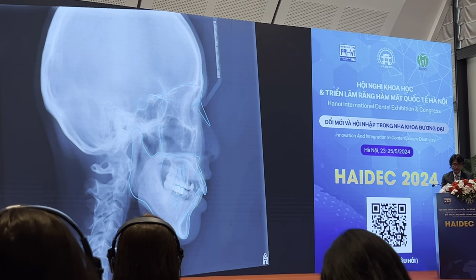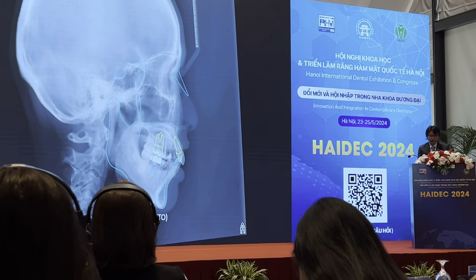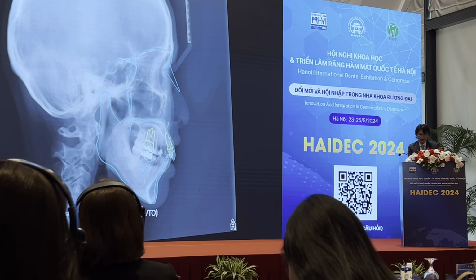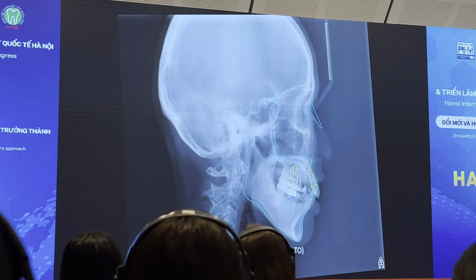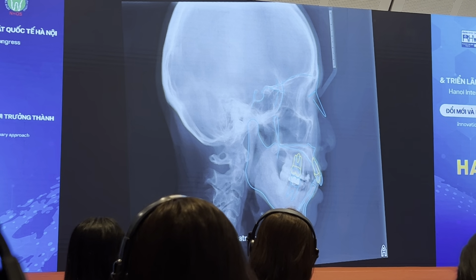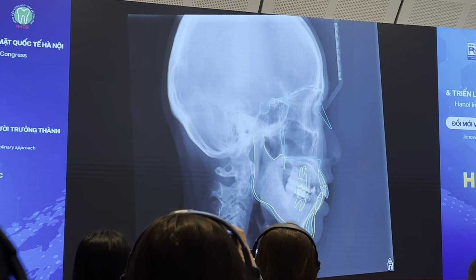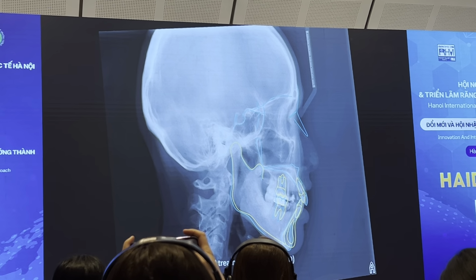The blue lines indicate the pretreatment teeth and jaw position. The yellow lines indicate the planned position, which was the visual treatment objectives. On the sagittal view, I plan to retract and intrude the upper incisors and intrude the upper molars. This was to improve the maxillary protrusion and total vertical maxillary excess, which would improve the lip competency. The intrusion of the upper dentition would cause counterclockwise rotation of the mandible, which would improve the lip competency and chin prominence at the same time.